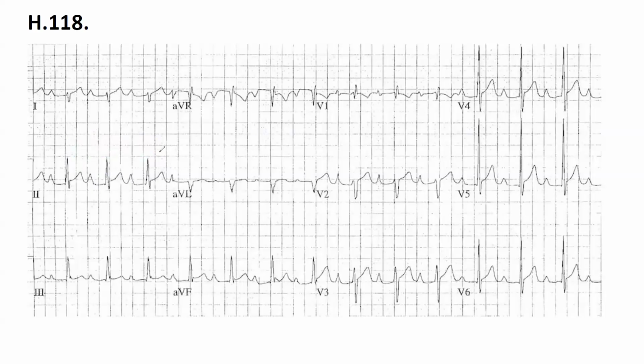Yes, very good. Next one, QRS. I think it's narrow. Yes, okay, narrow, good.